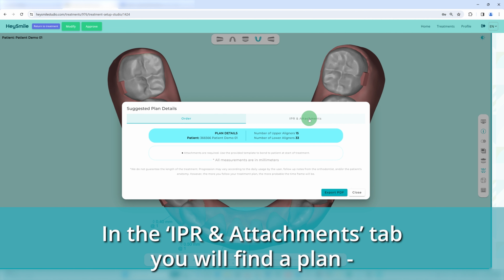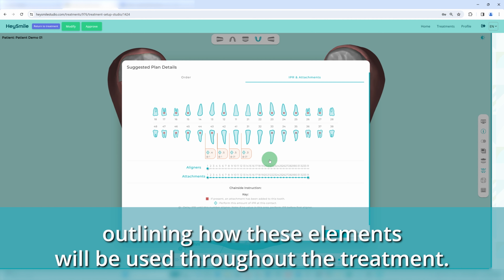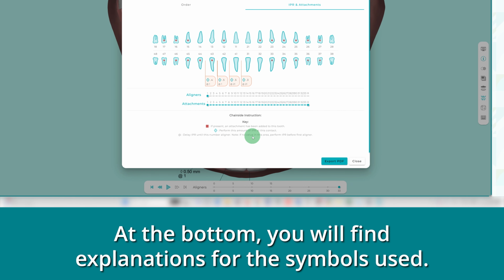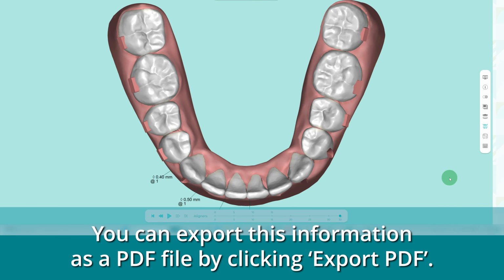In the IPR and Attachments tab, you will find a plan outlining how these elements will be used throughout the treatment. At the bottom, you will find explanations for the symbols used. You can export this information as a PDF file by clicking Export PDF.